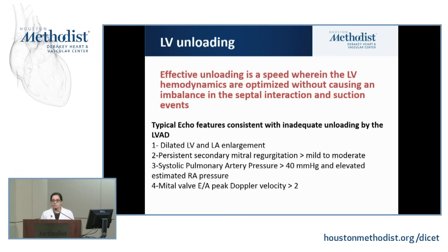Again, systolic PA pressure is greater than 40. We use the TR jet, and elevated RA pressures are something that we would like to know about. And the mitral valve E to A peak Doppler velocity greater than 2.